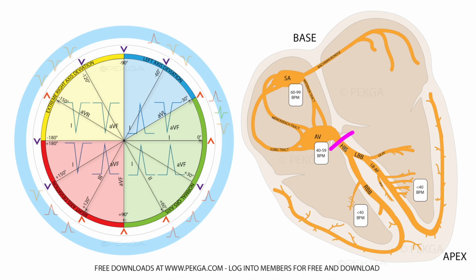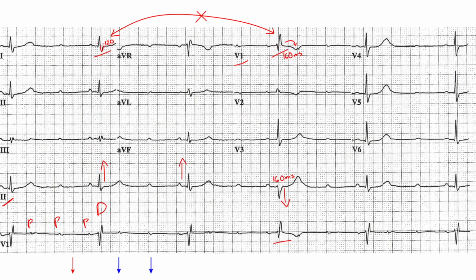So there's something going on with his bundle of His or hers. I'm not sure. I don't know anything about the patient. And then occasionally in this beat, in particular over here, what happened is the signal was getting through. The signal was barely getting through, right? It was trying, and finally something gets through, and then trying again, and something gets through.